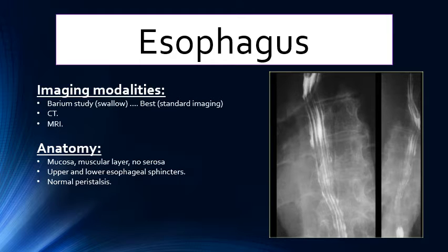As we see here in this barium study, we see the linear mucosal lining of the esophagus in the first exam of the barium, with a thin, dense layer of barium forming these lines, 3 to 4 lines of the normal mucosa of the esophagus. This is the normal appearance.